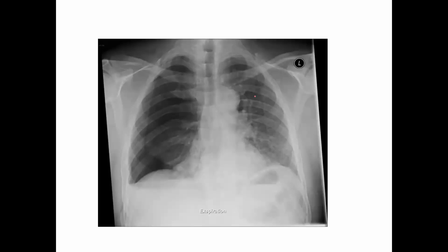Over here, we see some things that we've not seen just yet, and it definitely is visible, especially if you've looked at these. Your clavicles are straight across. You've got aeration of both lungs. However, you notice the vascular markings extend all the way out to the chest wall over here, but they do not extend all the way out to the chest wall on the patient's right-hand side.